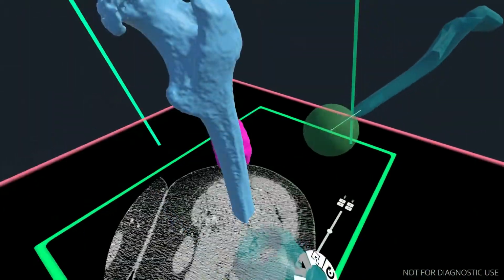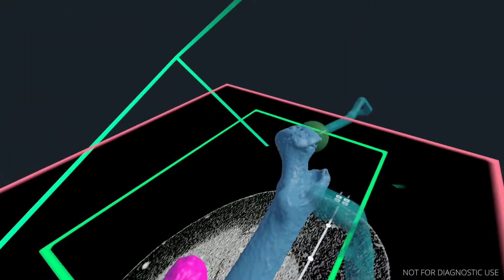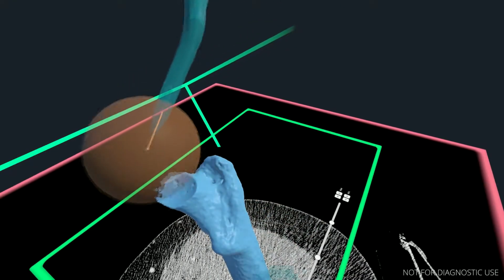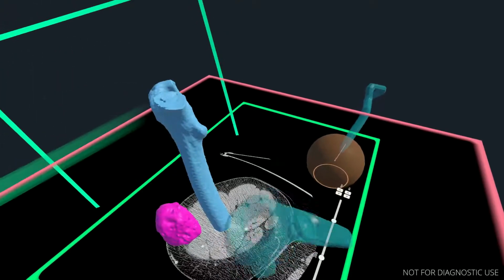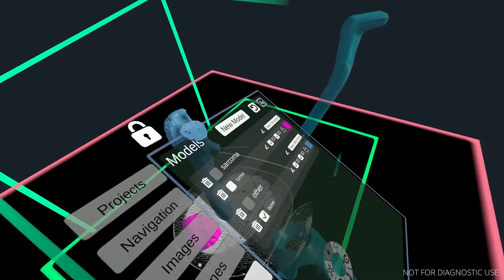Turn that on into 3D to show what we've done, or what we did rather. Yeah, I guess we can just, for time, we'll just stop up here. Don't need that much of the femur, and we can stop down there. Okay, so we have a pretty good femur there. Nice and quick. Now let's do some surrounding muscle.